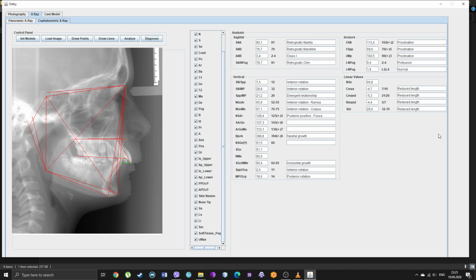It's nice. It has everything you need to make a basic orthodontic analysis. It lacks a Tweed, for example, the Tweed triangle, and I was hoping I would add some more values, but again, no time. So when you finish this, if you want to save it, you have to do a print screen. There is no save button, and you can paste wherever you want.